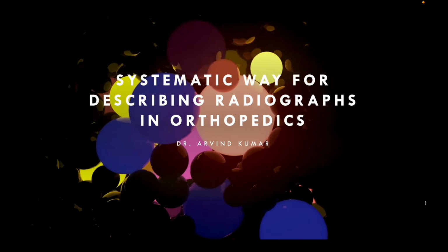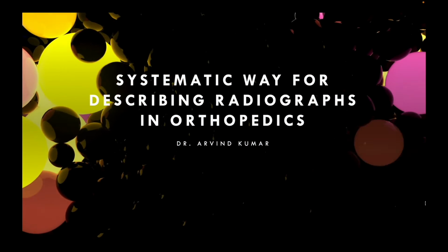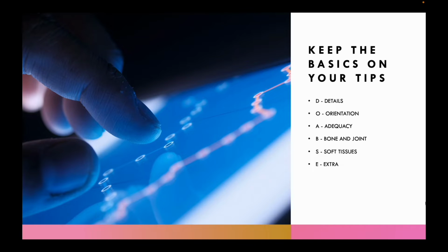Hello students, in this session I'll be briefing you about the systematic way for describing radiographs in orthopedics. The purpose of this lecture or session is to make you able to describe the common radiographs in orthopedics in a systematic manner. The basics of a radiographic description can be summarized in following points, which include first details, that is details of the patient and the radiographic part that is visualized in the film, radiographic film.